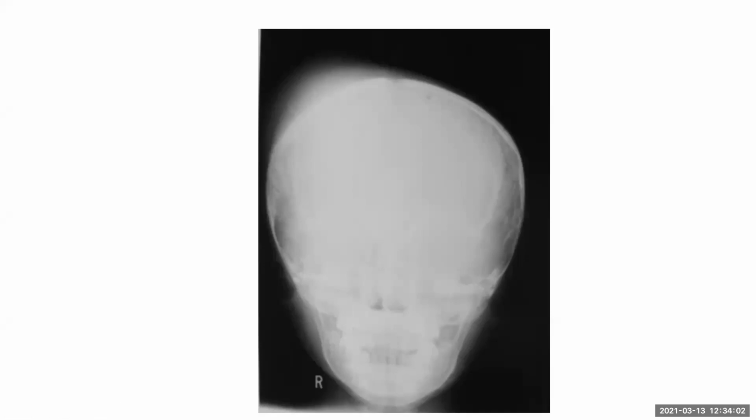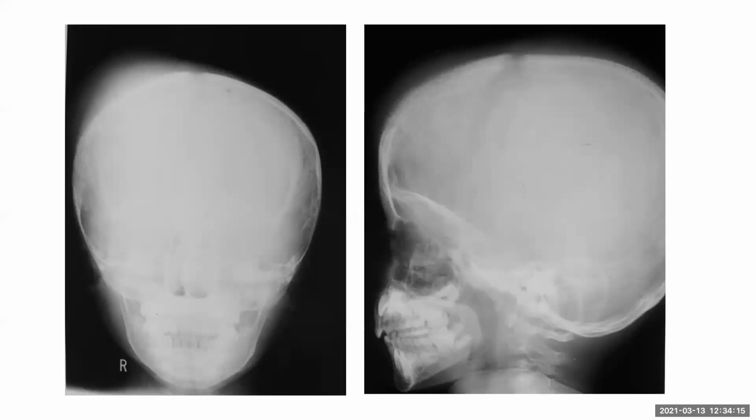The underlying bone appears slightly irregular, but I don't see any obvious defect there. I would like to see the orthogonal views if possible. Is any lateral view available? Here I'm able to appreciate a spiculated appearance of the frontal bone underlying the extracranial soft tissue swelling.